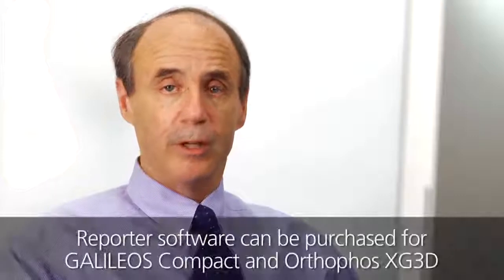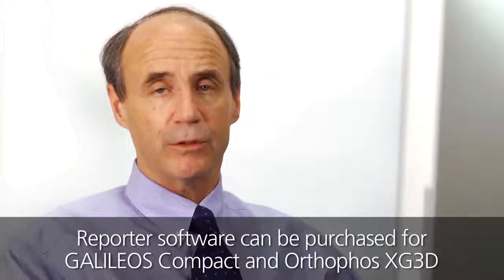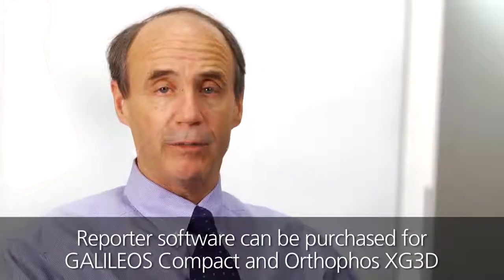But be sure to go up and down, back and forth in the axial and coronal views in order to thoroughly evaluate for any abnormalities. And again, if there are any questions, refer the patient scan or several pages of reporter to an oral and maxillofacial radiologist, or if in your opinion a biopsy is warranted, to an oral and maxillofacial surgeon.